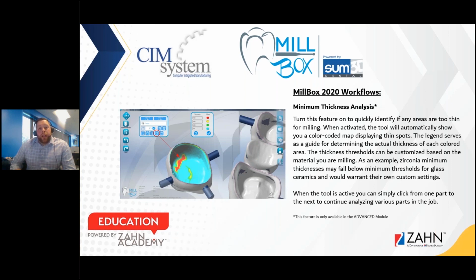So this is a good analytics tool to allow us to decide if there are going to be any failures or possible failures within the unit during the milling process. The milling software allows us to view those different areas based upon the color mapping system that you see here before us. And we can customize those individual thicknesses and the control settings of the Millbox software.